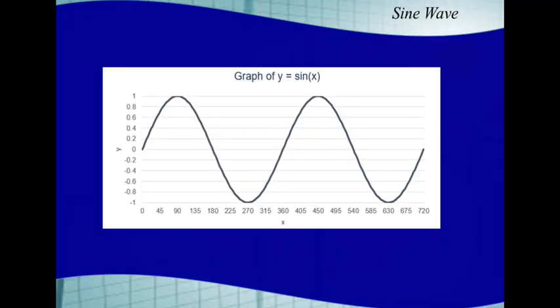So let's talk about some EKG changes with hyperkalemia. We're talking about a sine wave or close to what's going to become a sine wave pattern. A sine wave pattern comes from, like if you ever took trigonometry and had a graphing calculator and put sine in as your y-axis and hit enter, you would see a sine wave. Remember sine, cosine, tangent? The sine wave is simply a straight line up and then down and then up and then down without a lot of breaks in it.